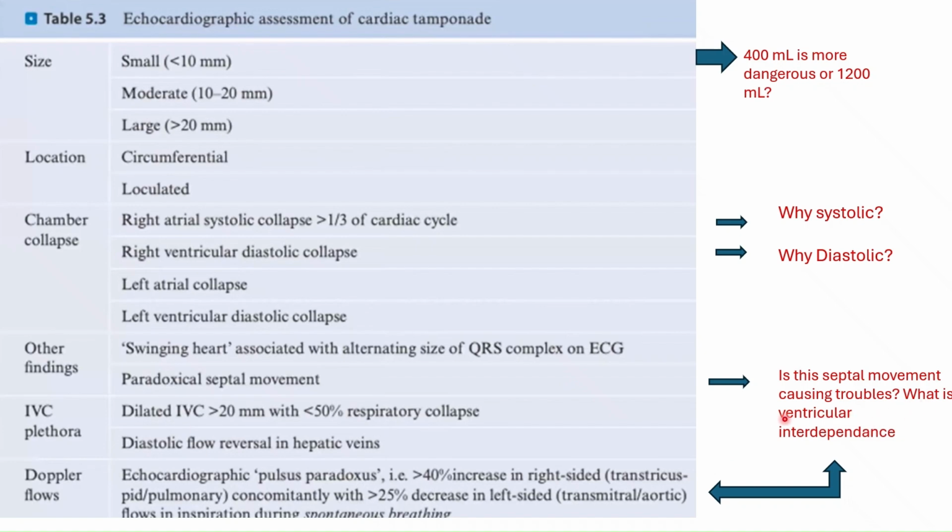And the name we call that is ventricular interdependence. Okay, so it means that ventricles depend on each other, on each other's filling, right? And if you have stretching of the right ventricle, it will technically push your septum towards the LV, and it will give you some kind of changes in your LV, right? So that's why we call this ventricular interdependence. And imagine we have all these changes in the flow during inspiration and expiration. We should be able to identify all these things on our echo machines, right? So we can see all this change of the flow pattern on our Doppler, right?